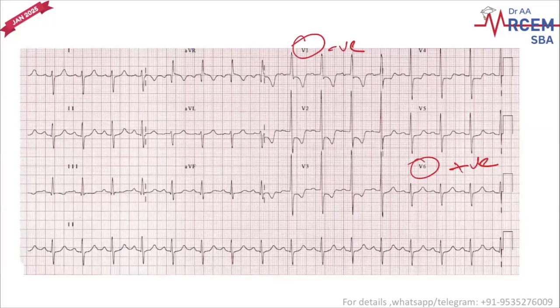This is inverted. In a normal person, the left ventricle muscle is quite thick because it has to pump the blood for the entire body. Here, because of the increased resistance in your lungs, the right ventricle has hypertrophied. Because the right ventricle is hypertrophied, the electrical activity happening in the right ventricle is much, much more than that of the left side.